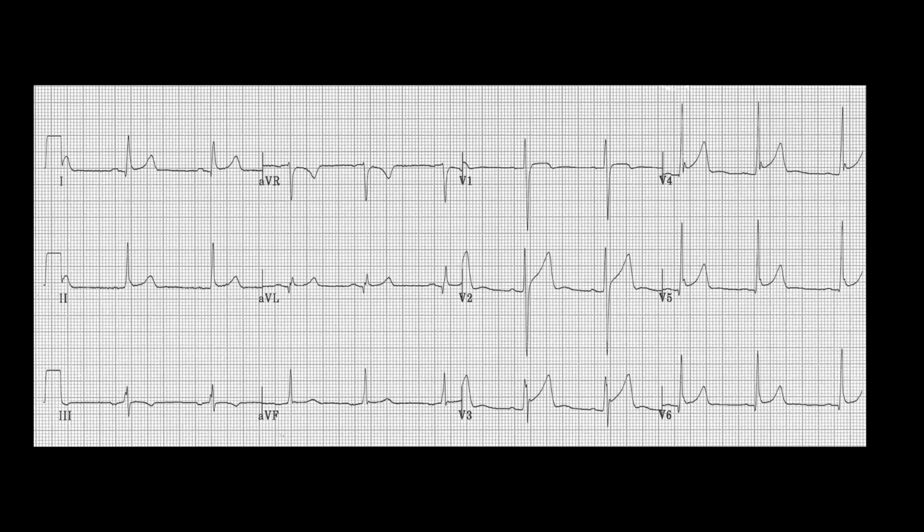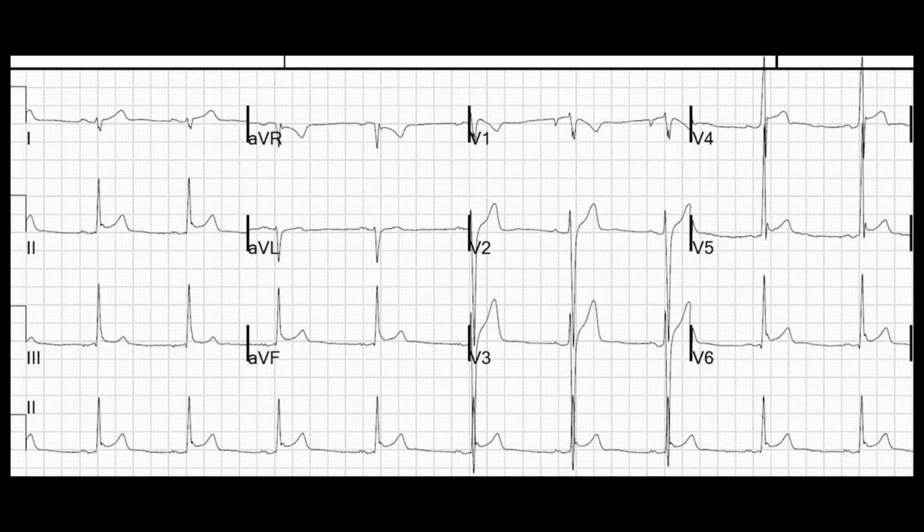So there's an example. Like I said, very similar to pericarditis. You see the diffuse concave ST elevation, the smiley face, most prominent in the anterolateral leads with a notching pattern present, indicating a STEMI mimicker, in this case, benign early repolarization. And another example. Again, looking at the anterolateral leads, you see ST elevation, not a lot, but you see that Osborne wave present, very noticeable in V5, and a little bit in V6 and V4. Again, not a STEMI, just some ST elevation.